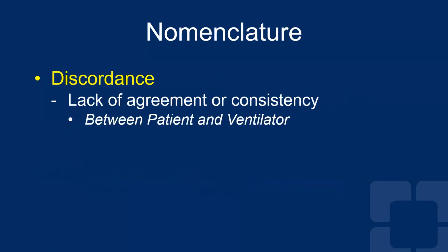We have described a method, and you'll see a little bit as we go through the waveforms today to try to make them clear for everybody, that we usually will describe what is controlling and what type of mode we're using. We will see several cases in which we have to use the time constant and the characteristics of the waveforms to determine if the load is elastic or resistive.